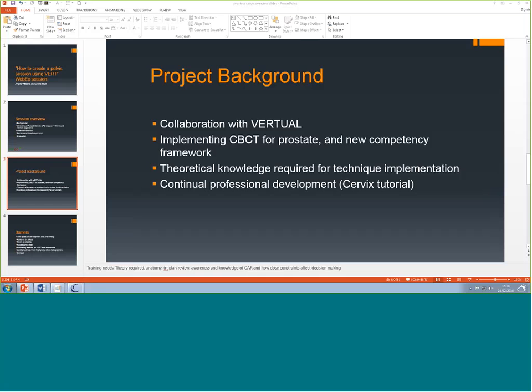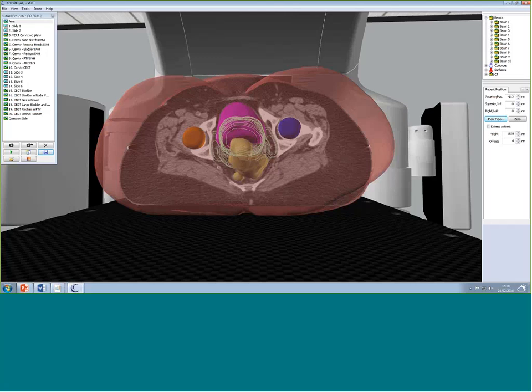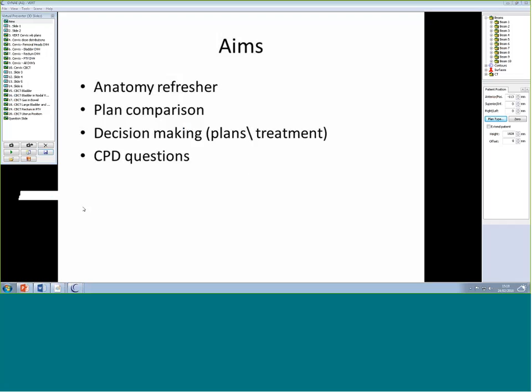Thank you. That's right. So I'm going to move into Vert now, and we already have loaded up the session that Avina's going to talk about, which is the Cervix session. But I thought it only right to show you how to put this session together. You can see here on the Cervix session that we have the virtual presenter loaded up, and I thought it was a timely place to do a quick refresher on the virtual presenter. Now, all of you will have received these training materials as part of your 3.1 download, and you need to put these together to be able to view them in the right way. So I'm going to show you how to do that.